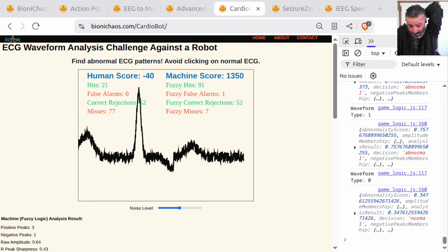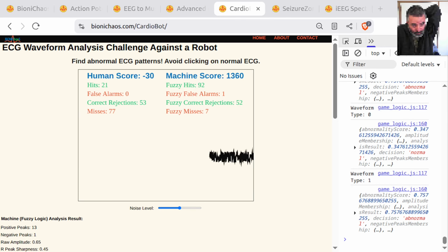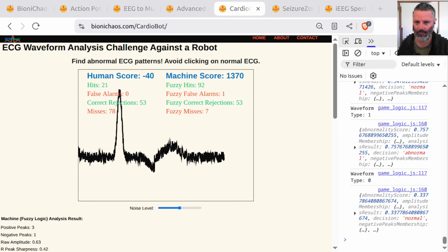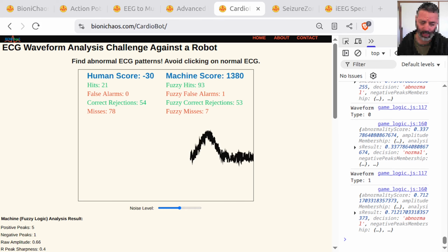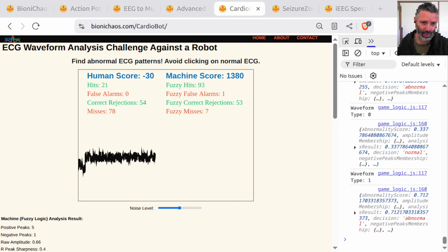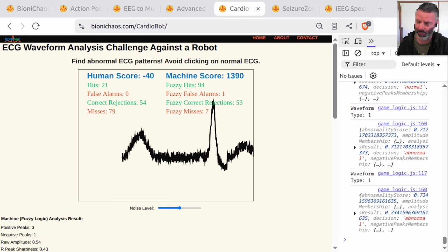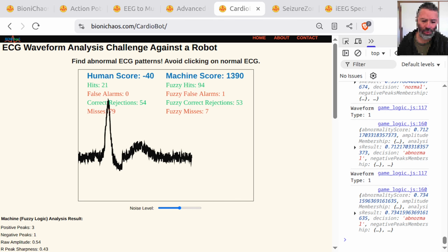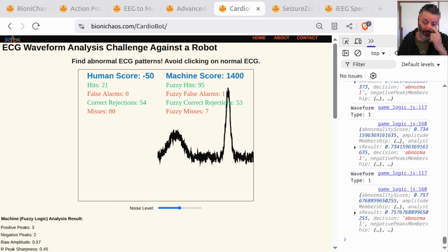It's fuzzy logic based. So currently this tool has a backend, and I'll share with you some of the ECG processing and the fuzzy logic analysis. Maybe you can explain those as well. But don't include any code in your explanation.